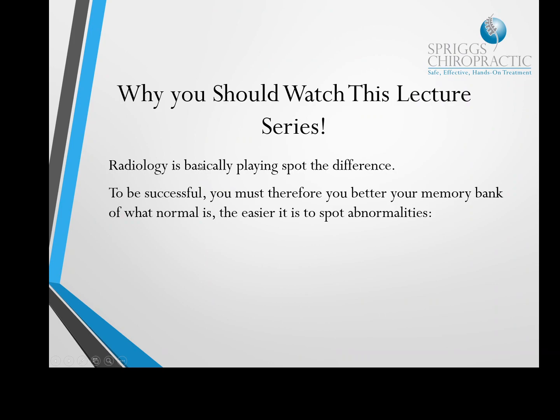Just to reiterate from the last lecture, if you've been following us in this series, last week I went through the normal appearance of the hand and wrist, and I just want to reiterate the reason why you should be following this series is because the game of radiology is basically playing a massive game of spot the difference.